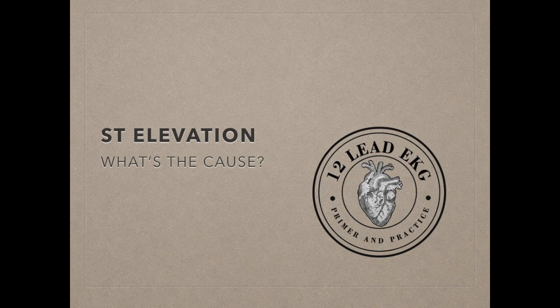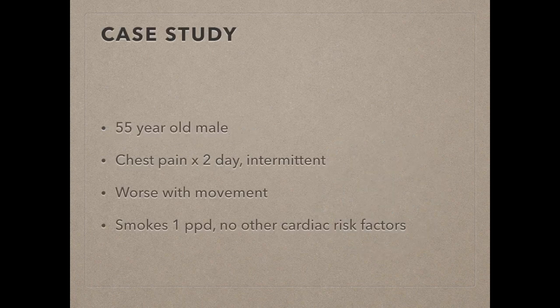This one is on ST elevation, and we're going to try to figure out what the cause of this ST elevation is today. So we've got a case study. A 55-year-old male comes into the emergency room complaining of chest pain. His chest pain is off and on during the past couple of days. When asked what makes it worse, he says when he moves around, it tends to aggravate the pain. And if he can sit still, things get a little bit better.